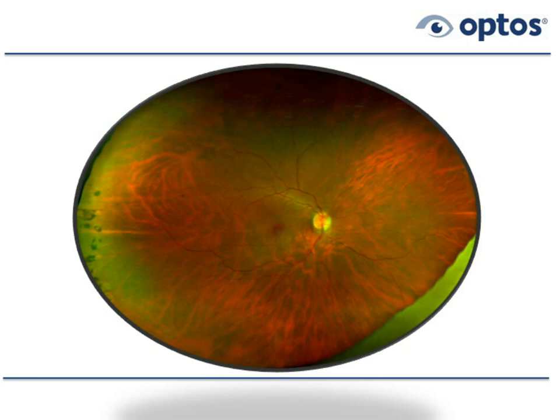So her disc looks okay, her macula looks okay. If we go out all the way temporally, we see sort of a pigmented lesion, and this pigmented lesion looks fairly typical for, say, paving stone degeneration. Now, if you're close to the age of 50 and you're close to having 5 diopters of myopia, you have about a 40% chance of having paving stone. Paving stone is more common as you get older, and very common in myopes. So that's the right eye. Acuity is 20/15, by the way.